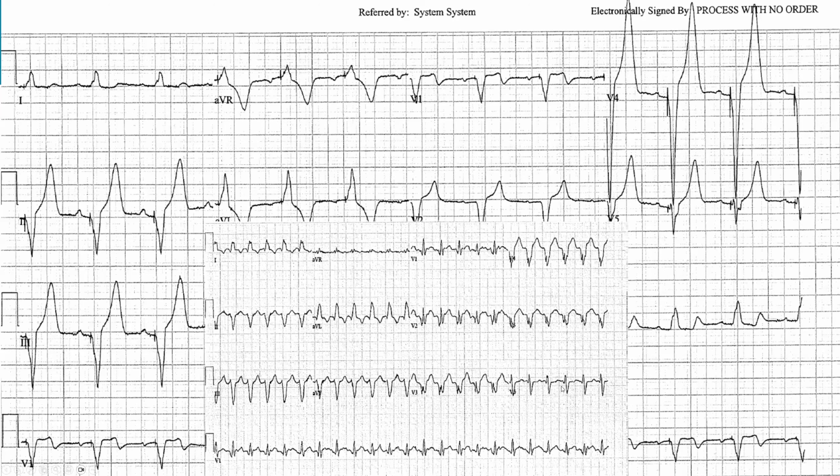So in this patient, just to be complete about our thinking, there's no evidence of ventricular pacing because again, a wide QRS complex, even with tachycardia, has two native explanations, meaning is it ventricular tachycardia or is it supraventricular tachycardia with aberrancy? Or lastly, is it not the person's own rhythm at all? And are they just pacing from the ventricle? Well, no clear evidence that this is ventricular pacing either for this patient.